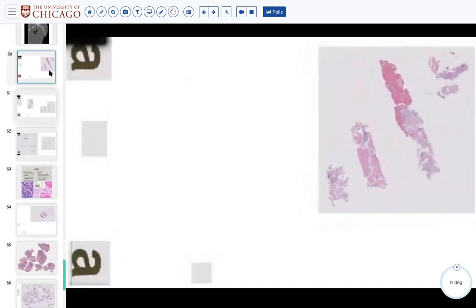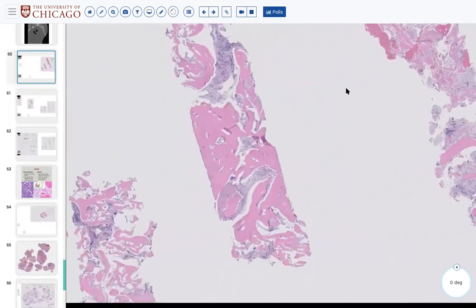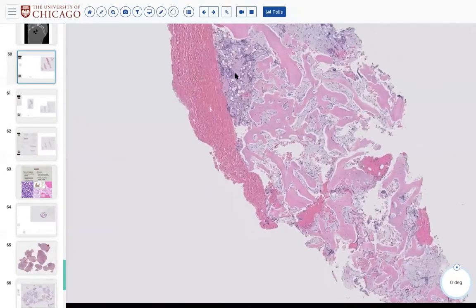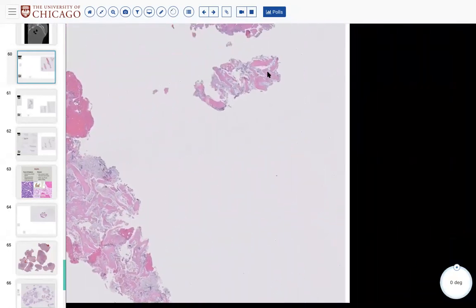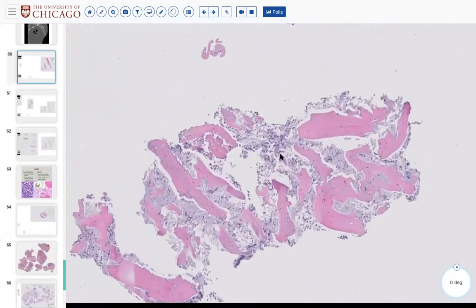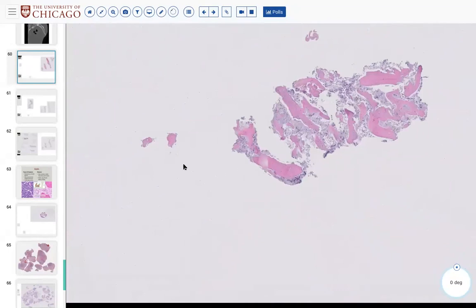So when you are dealing with a bony lesion in an old person, there's basically 5 things on your differential. What are your top 5 things? Mets. Yeah. Mets, and Mets. Okay, great. And then the second thing, which I'll show you in a minute. So, who wants to describe what they see here? I was kind of saving myself for this one. Well, take it then. Everyone else seems to be sleeping, so you go for it.